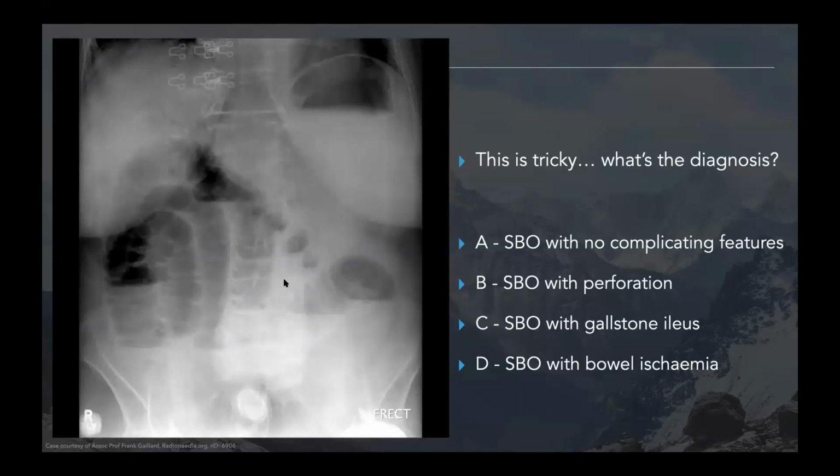Okay, this is really outrageously tricky. And we're getting towards the end of the talk now, so we're just sort of enjoying ourselves. I'd be very impressed if people get this. The game is slightly given away by the fact that we're talking about gallstones. If you could chuck up a poll, please. But just think, if you were looking at this in an exam, what would you say? How would you get around this? You don't know, for the sake of argument, what the diagnosis is, but you're just trying to describe it in a way that makes you sound sensible. Okay, if we could end the poll.